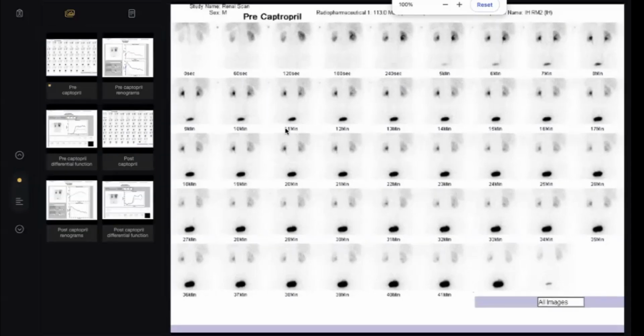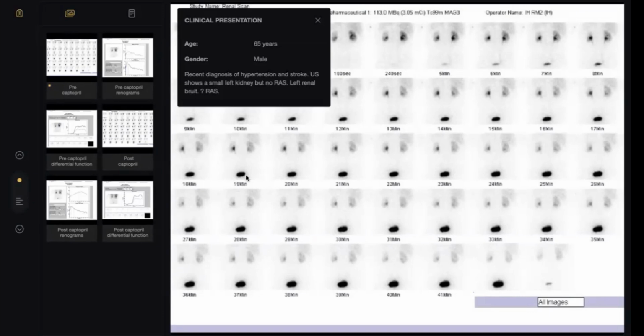I will run the session as usual, case by case. For example, this is a renogram. After each case is finished, I will give some notes about the normal MAG3 and the curve, everything. I think this is more interactive and more interesting. Let's start with our first candidate. I think my voice is audible, the image is good, everything is good.